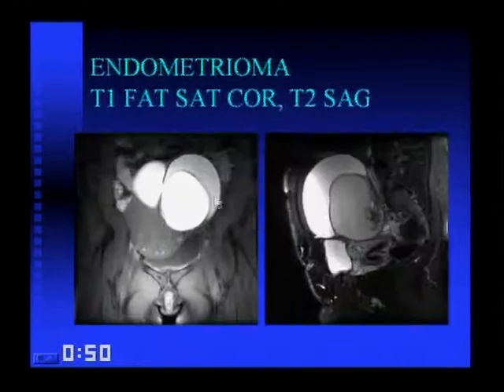Just more images of it. You can see this one has debris in this component. You can see the mass effect on the bladder, and here's the uterus being displaced.